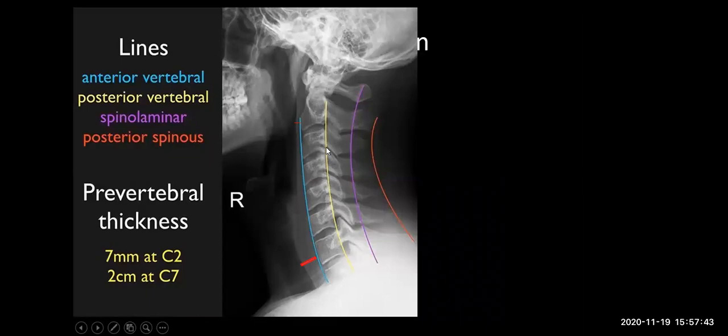You should always review the alignment of the cervical spine, the vertebrae. You have four vertebral lines, which should be aligned together with no disruption, which is very important in trauma cases. But today, unfortunately, there will be no time to review the traumatic injuries of the pediatric age group. Whenever you are looking at the lateral radiograph, please pay attention to the orientation and normal alignment of the vertebral bodies, especially the atlantoaxial articulation.